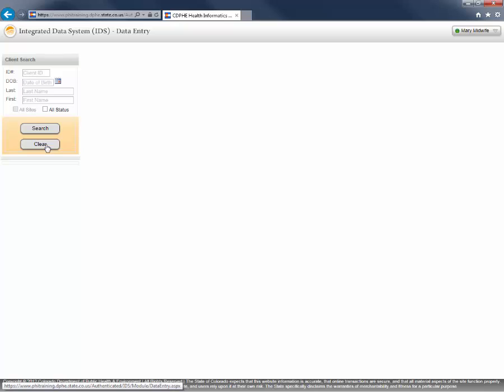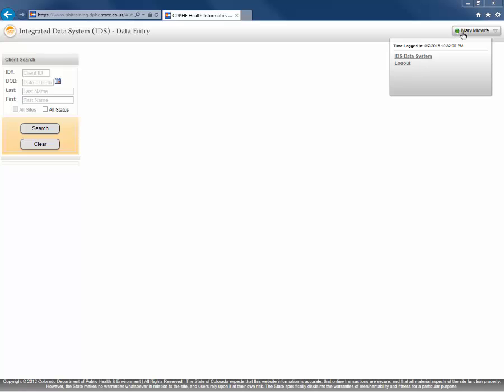All I do is I click Clear, and I begin my search again. When I'm finished with all my reports for this session, all I need to do is just go to the top right hand area and mouse over my name, and then come straight down and over to log out.